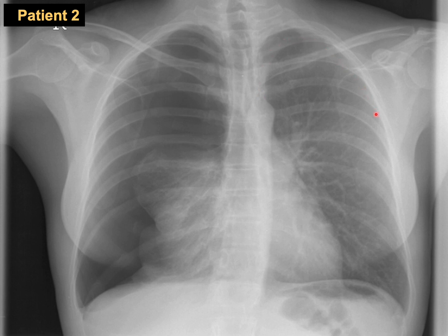Then go for B, the lungs. I'm going to start with the left side, the non-injured one. Okay, and the lungs can reach the very distal 1/3 of the lung. Then when I go to the other side, it's very homogeneous here, and I cannot find the bronchovascular markings except for here. So definitely you can appreciate that she's a female, and this is the breast shadow. So this is the lung, this is the collapsed lung, and this is the border of the collapsed lung, and this jet black appearance is a pneumothorax on the right side.